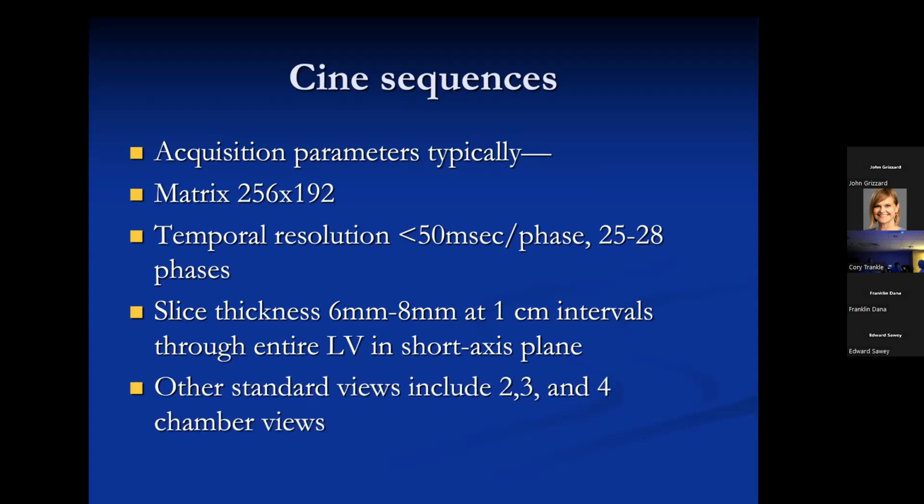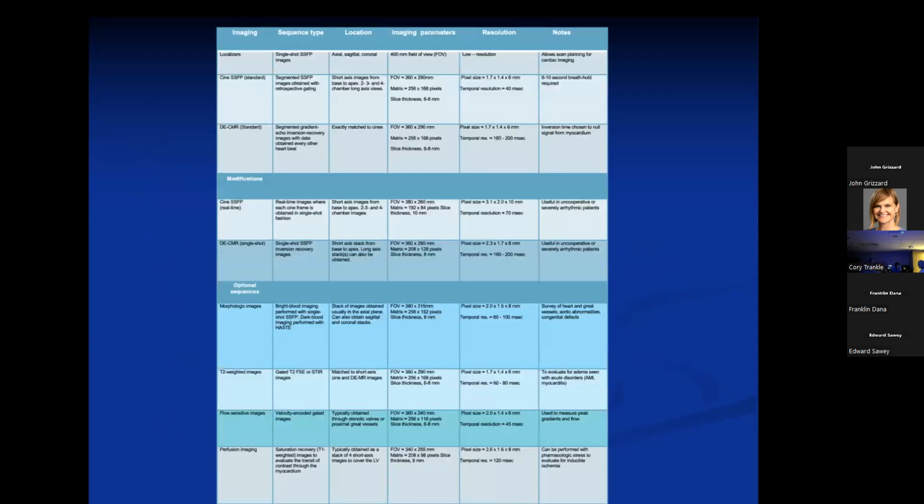Standard views include the complete stack of short axis images that enable us to calculate function and so forth. The standard views also include 2, 3, and 4 chamber views.